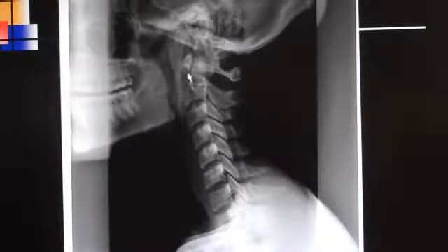We've talked about the odontoid process, which is part of C2. The body of C2 goes all the way down to here and all the way across to here, and then back up to there. And so that is the body portion of C2. This density right across here is the transverse process of C2. And back here in this area would be the lamina of C2.